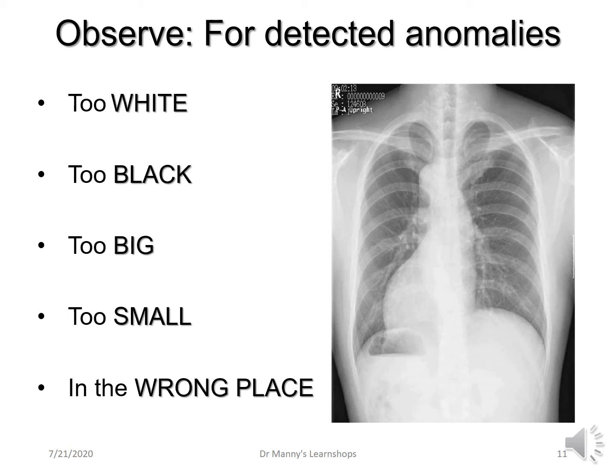It may not be abnormal; this may be an adult who is born with dextrocardia. And as we said, situs inversus basically means the stomach is on the right side under the right hemidiaphragm, and the liver is on the wrong side under the left hemidiaphragm.